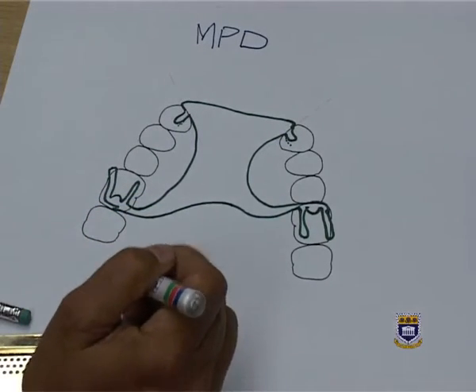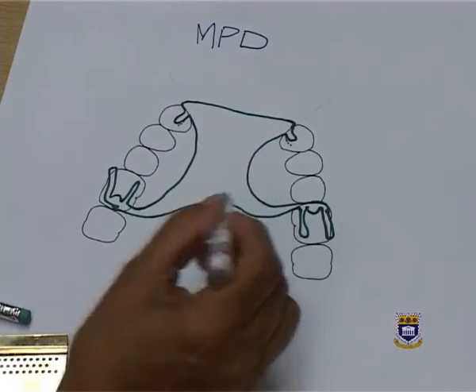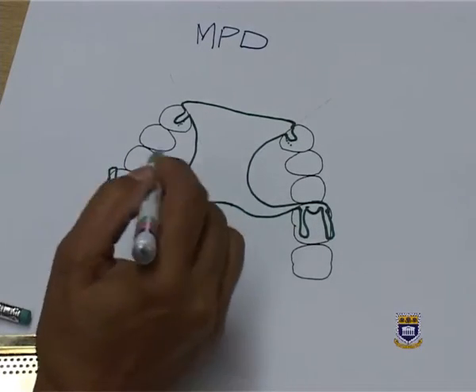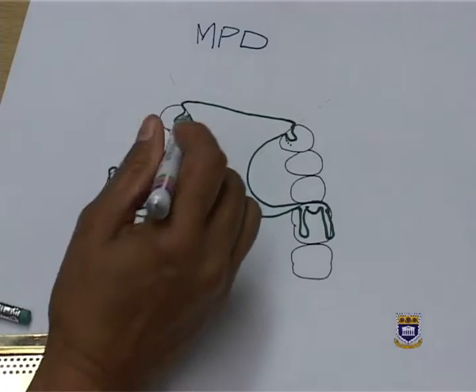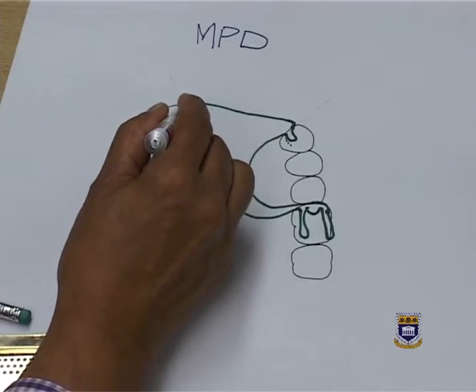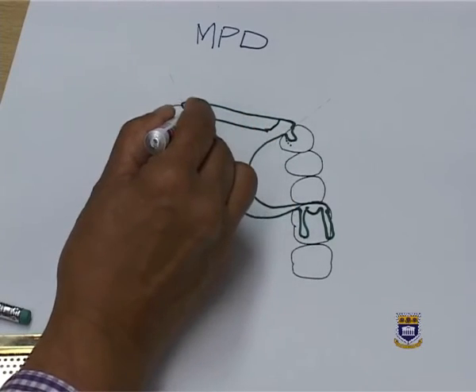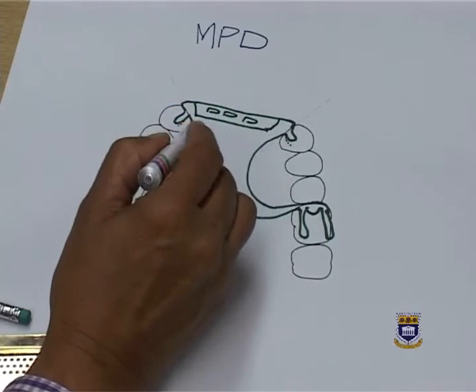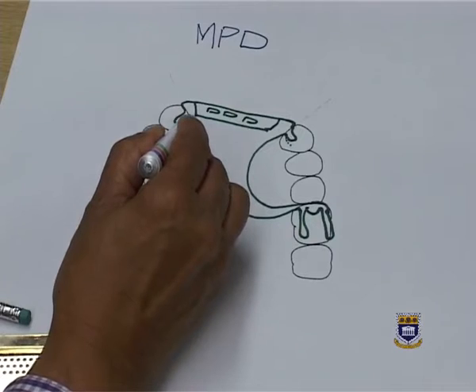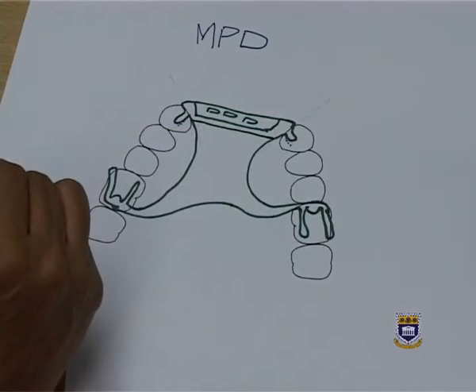And there I'm joining. So I'm checking whether I have connected all my components. And because this is a metal partial denture, there are additional things that I have to add. And in front usually we will have perforations to which our acrylic will be attached. And I will show you that on a model just now. And we have to include this finish line.